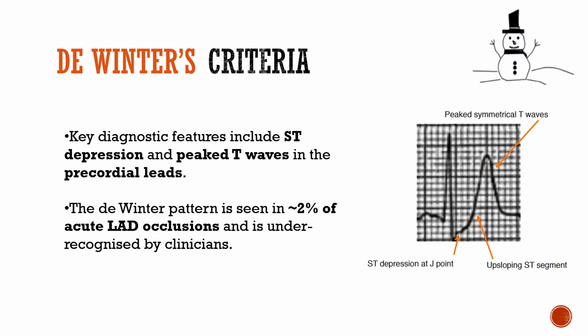The de Winter's pattern is seen in only 2% of acute LAD occlusions and is definitely underrecognized by many clinicians, except for you, because you watched this lecture.